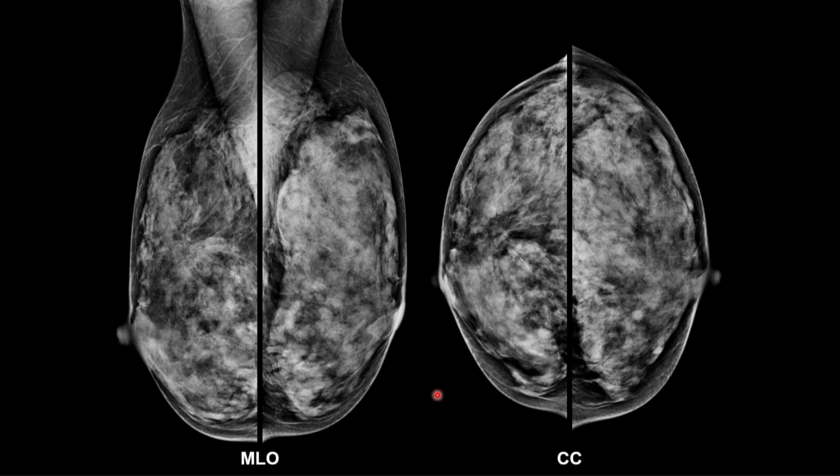I agree with everything you say. The one caution I would make is that ultrasound evaluation of a one-view finding is very tenuous, because you don't know exactly where it's located in 3 dimensions, if it's real. So you have to scan pretty much half the breast.